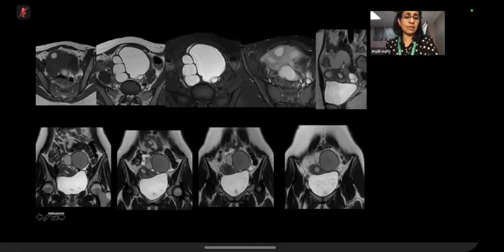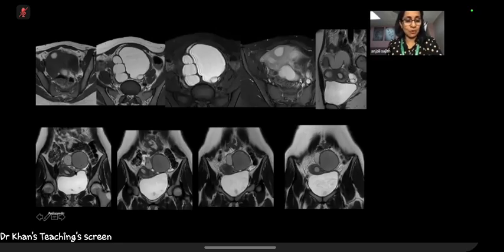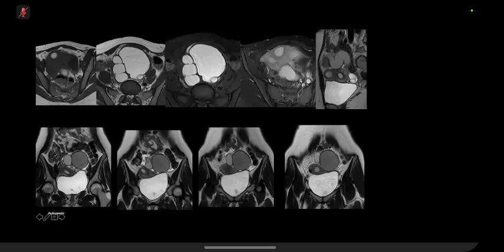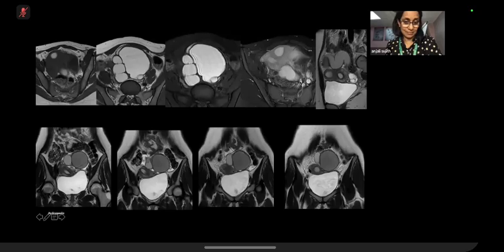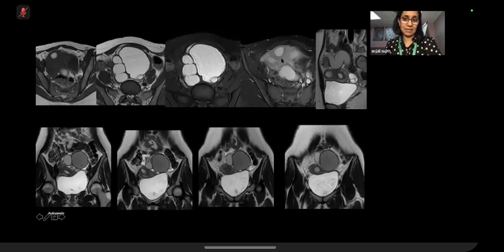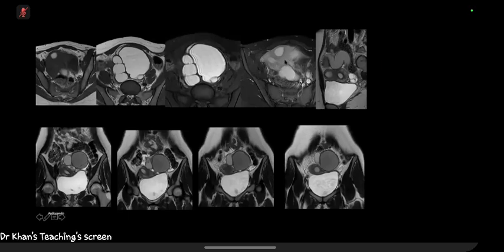Okay, don't worry. In the lower slices, I should have explained it better. I have given serial coronal images. This is from the back, posteriorly, and coming forwards. So as I'm coming forwards, I can see the first uterine cavity, and it's sort of ending here. And in the anterior-most image, I can see suddenly a second uterine cavity. Okay. So it isn't behaving like a simple cyst, these lesions, and is behaving like blood on the fat sat sequence.